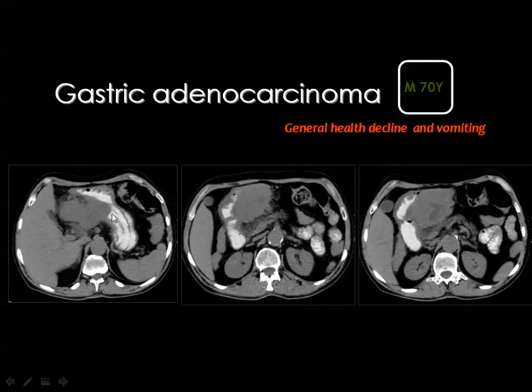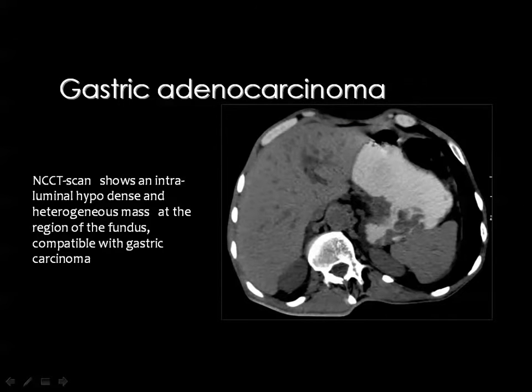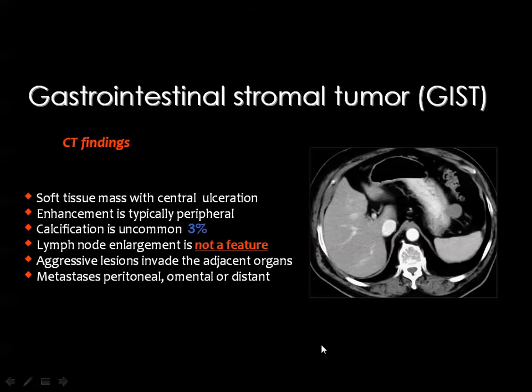And this is a stomach where you give gastrographin, and you can see this mass which is bulging outside the gastric lumen, and also involving the proximal part of the duodenum, which is stained by the orally administered contrast media, diagnostic of a malignant lesion. Then if you look here, this is the CT scan, and this is the stomach, this is the liver, the spleen, and the kidneys, and this is the site of the gastric fundus. And you can see that there is marked reduction of the lumen and severe infiltration of the gastric wall on both sides by this malignant neoplasm.